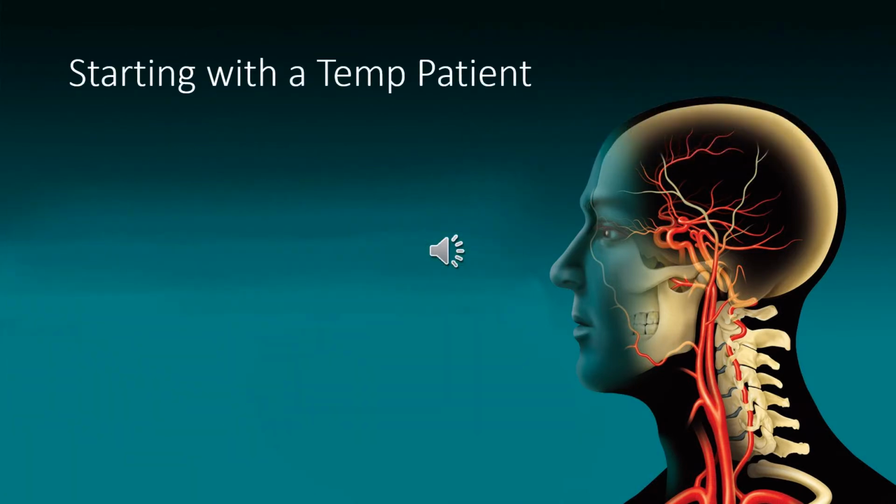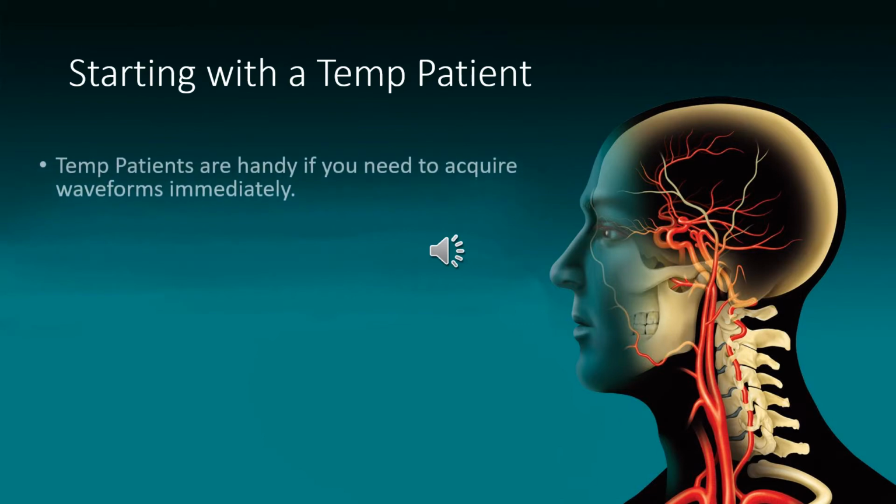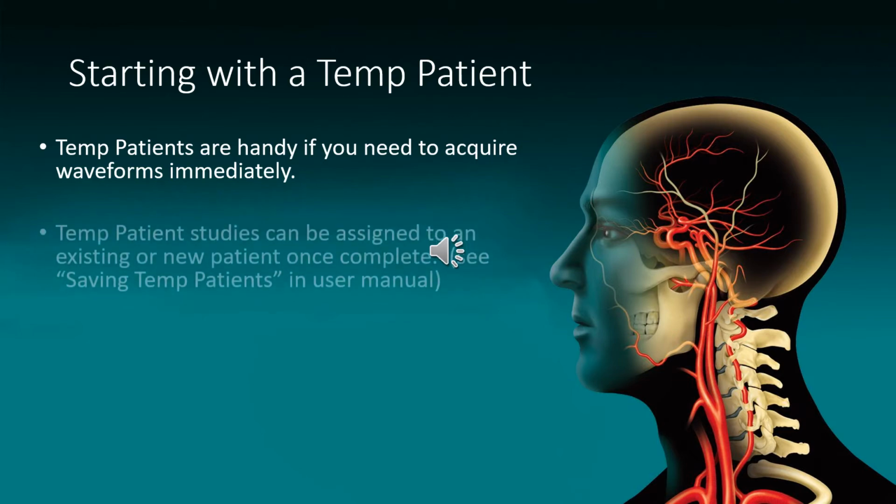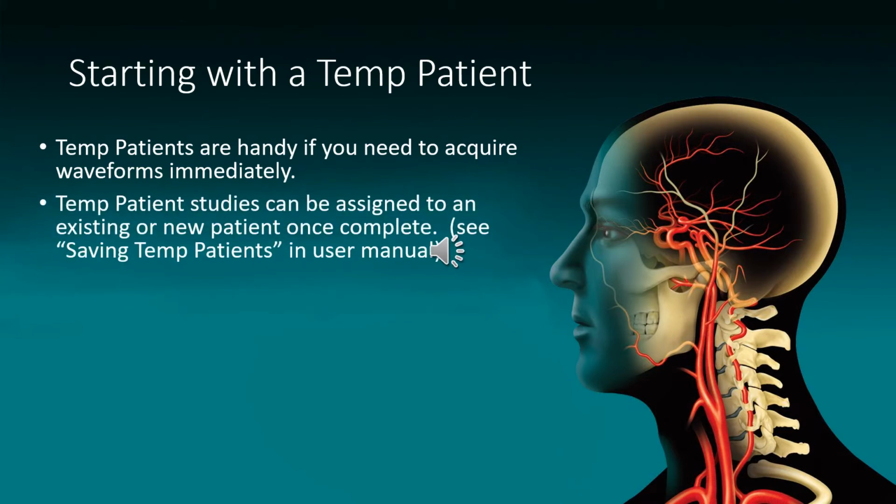Starting with a TEMP patient. TEMP patients are handy if you need to acquire waveforms immediately. TEMP patient studies can be assigned to an existing or a new patient once you complete the study. I'll show you how to do that a little further on in the video.